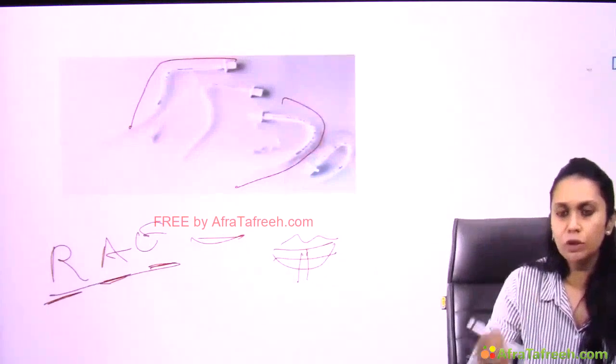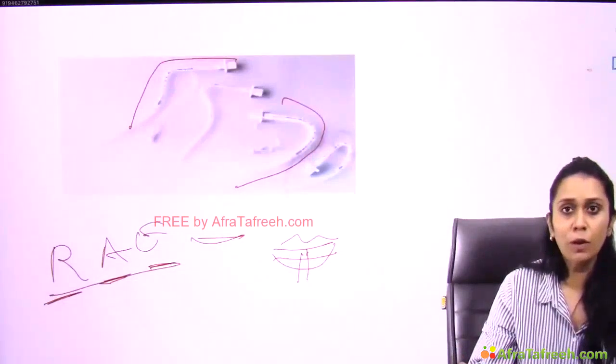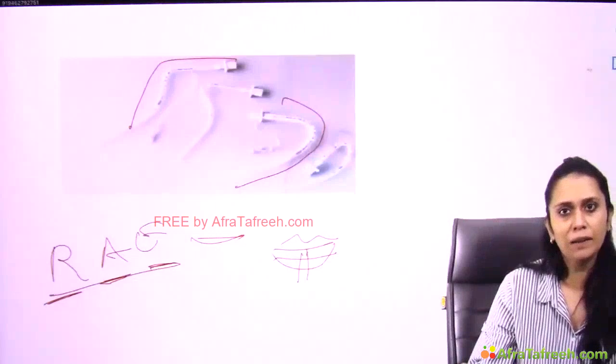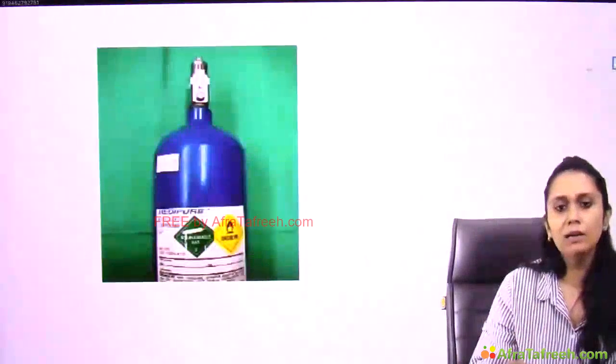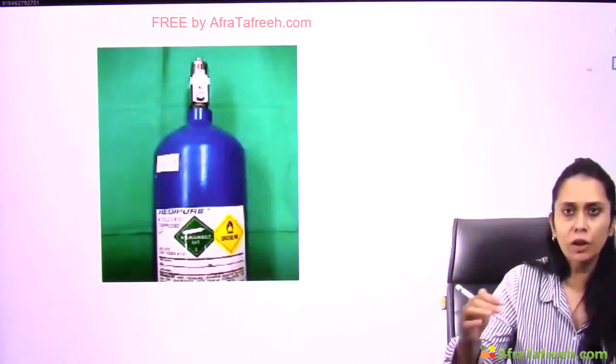If I have to fix the tube in the middle of the lip, I put this RAE tube. This is specially used for what type of surgery? Cleft lip and cleft palate surgery. Then this is a nitrous oxide cylinder, blue color cylinder. Nitrous oxide has a color coding of blue.